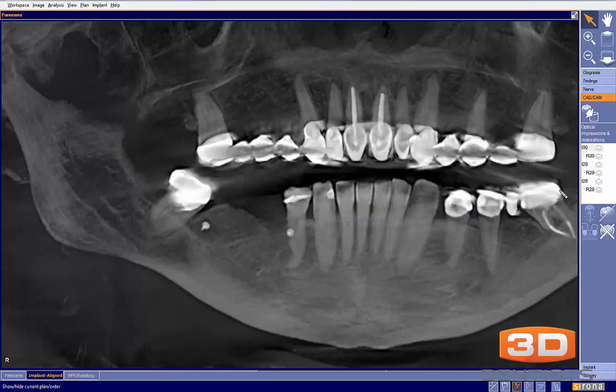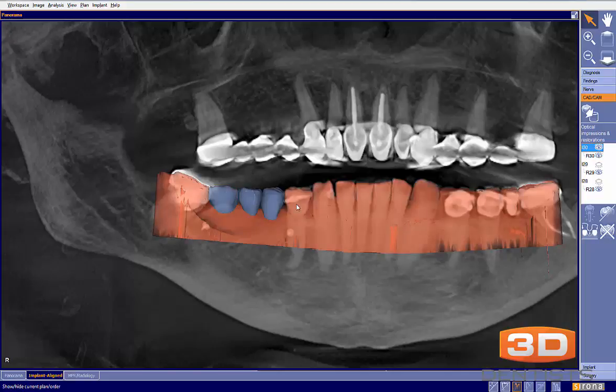The other area that I would like to comment on is right here. You can see that this was designed as 28, 29, and 30, which makes us have to bring in 3 individual SSI files, which is not a big deal, but when we have 3 consecutive teeth like that, we can simply call it a bridge in the software, and we can bring it in as 1 file. So just from a design and ease of importing, I would prefer to call this a bridge in the CEREC software to do our virtual wax up.